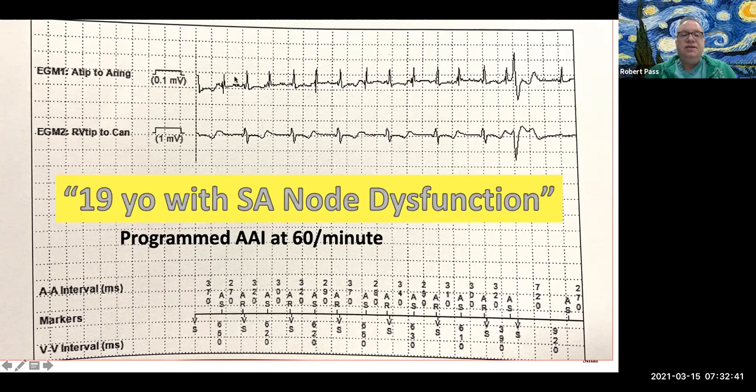So you're right. There's two possibilities here. Either the patient is in some kind of atrial reentrant tachycardia with, as you said, what looks like probably 2-to-1 conduction, or this could just be sinus tachycardia, and the AV node doesn't work very well. Now, somebody put a dual chamber pacemaker in this patient, so presumably there was some concern about AV conduction.